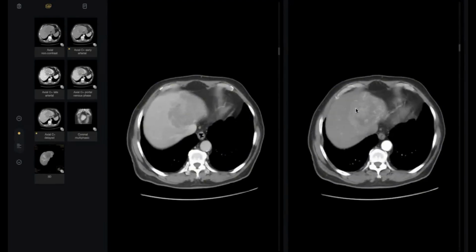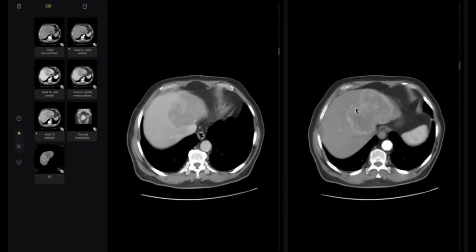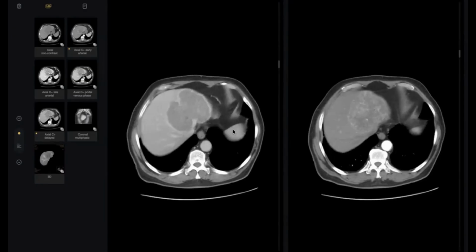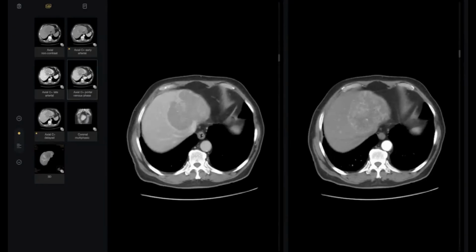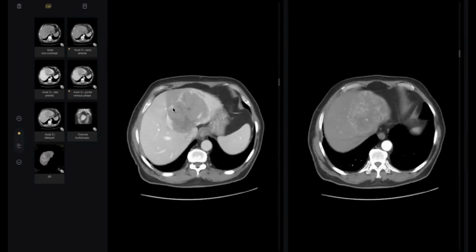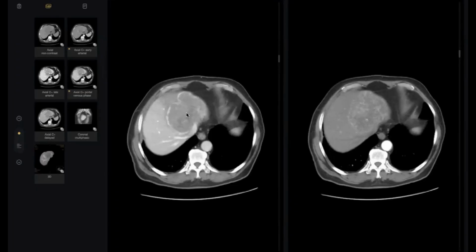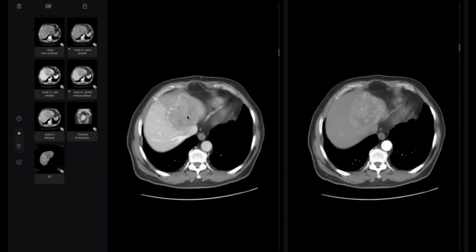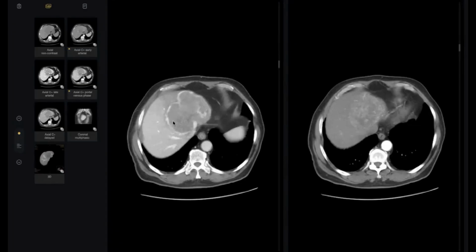What happens? This is a non-cirrhotic liver. But look here, there is central heterogeneous hyperenhancement. And when I give him the portovenous phase, he remarks that in the center there is some washout. Look, at least here, hyperenhancement centrally. Here, not present. And besides that, the center here is less bright, less enhanced than the parenchyma, so this is washout.